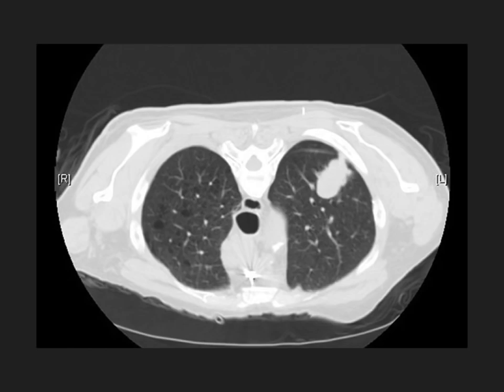The next thing I want to show you is that we're going to go back to the lungs here. We know that we're in the lungs because we see lung markings on either side. Something interesting to note is that this CT scan was actually taken with the patient prone. The reason that I know that is that on the top of the image, I see the vertebrae and the vertebral body is pointing downward. So this patient is actually laying on their belly on a table, and the CT scan is taken in that direction. What pathology are we seeing in this lung field?